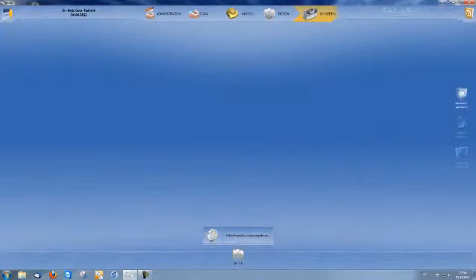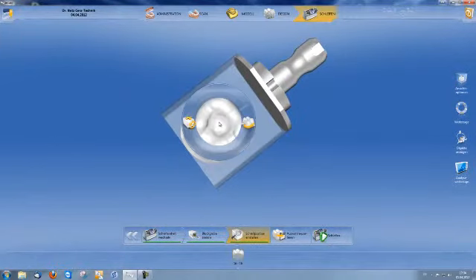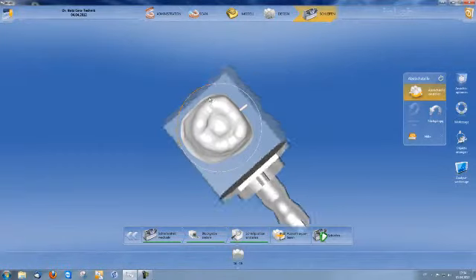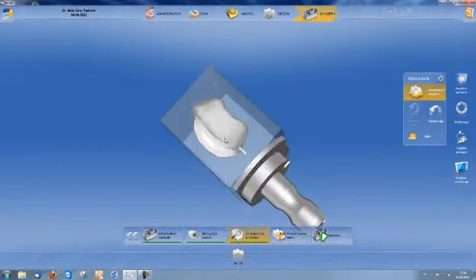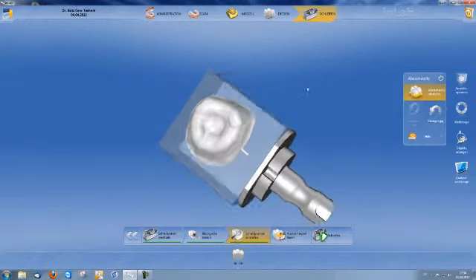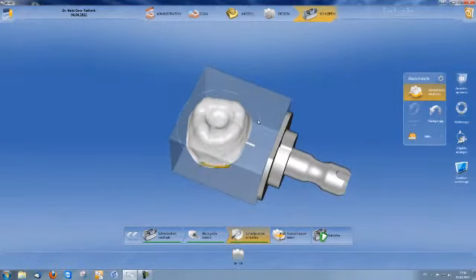I now jump to the milling mode where I can change the sprue location. If necessary, proximally, in order to avoid aesthetic flaws. I could now produce the framework ceramic via milling.